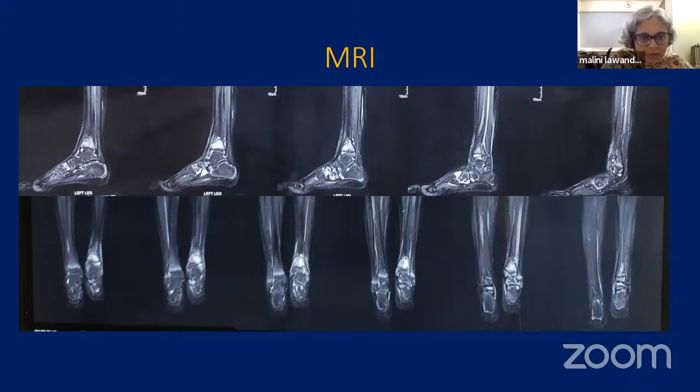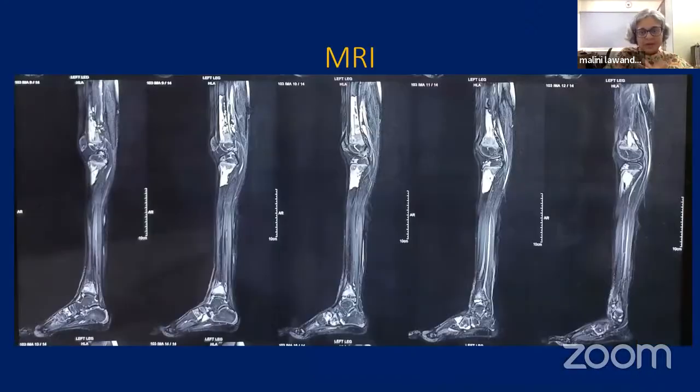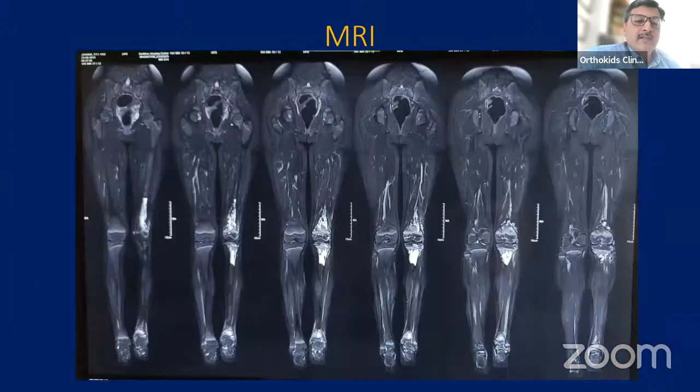Let's look at the knee MR also. Go ahead with the knee. This radiograph is on. Now it's a full image. I'm sure you want to see all the other images, but do we have any coronal? Yeah, here it is.